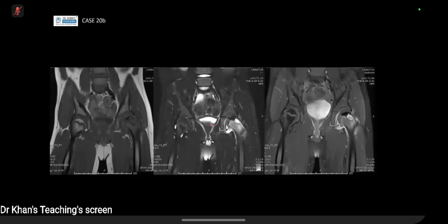When you look on the MRI, so that's T1, T2, and post-contrast, that lucency corresponds to this low or isointense T1, high T2 lesion within the metaphysis with a little contrast enhancement. Some joint fluid, but not much in the way of synovial thickening, because all of this is probably just joint capsule. So this is a trick question, and I think it also tricked us all.